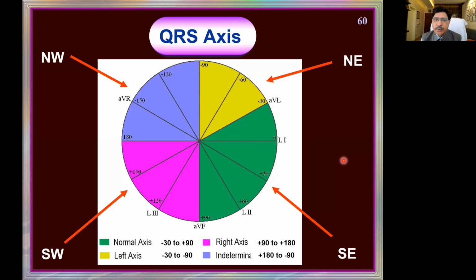Then how do I place my ECG axis in these 4 quadrants? I am interested only this much. I am really not interested in 30 or 60 or 65 or 70 or 33 or 34. Clinically, it is not very important. Is it the normal axis, left axis, or right axis? That is the clinical interest. Of course, you can always say I have 33 degrees, another ECG is 66 degrees. Everything is normal, like saying a height of 5.2 versus 5.6, 5.7, everything is normal only.